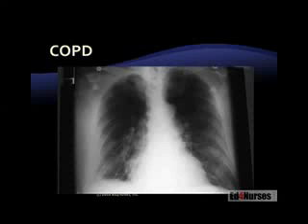These are hyperinflated lungs. Also, notice how dark the lung tissue is up toward the top. So these are hyperinflated lungs. This is consistent with COPD. Next, assess the pleura. Very dark. We were just talking about that, so darker than we would anticipate. Look for infiltrates. I'm not seeing any infiltrates on this particular X-ray. We are going to look at some other ones that will help you to identify those.